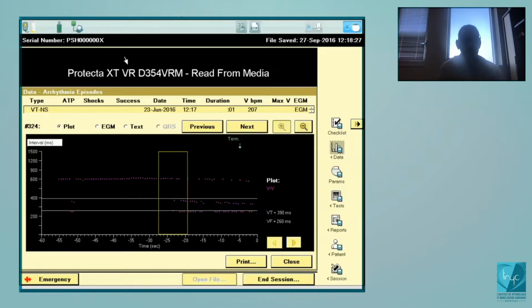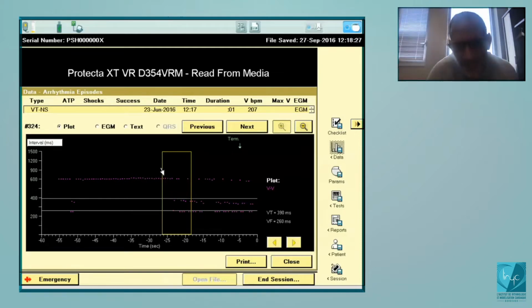Well, single chamber ICD with a 2 zones program, 1 VT, 1 VF zone. And we see a classic pattern of railway. Yes, you see these 2 lines here, and it looks like oversensing. Yes, the sum of these 2 intervals equals this one. If the sum of this plus this equals this one, it is very likely that this corresponds to a problem of oversensing. Which kind of oversensing?